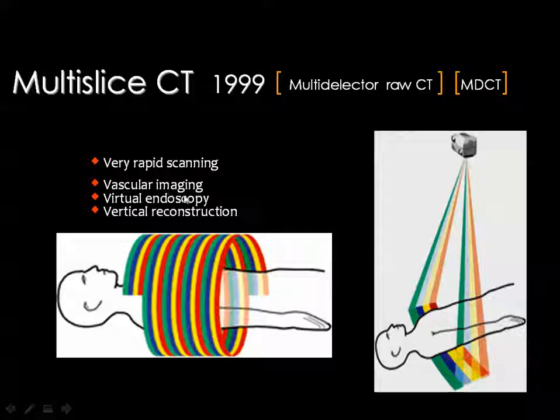Then also virtual endoscopy. You can go through any tube in the human body using this virtual endoscope built in the CT scan.